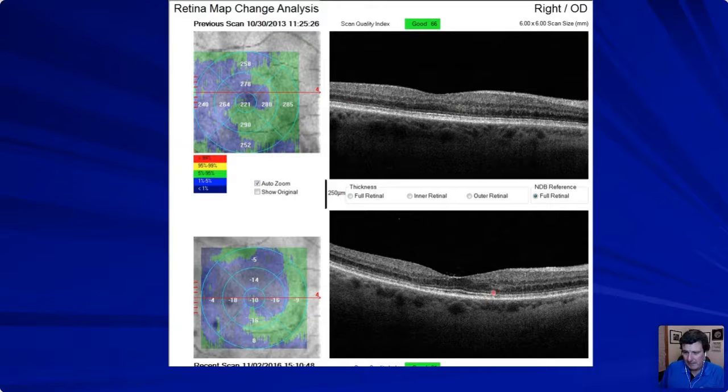But look what happened in 2016. It's a little bit more obvious. There's two ways I'm going to tell you. You want to look in this area, but look at the contour. I'm trying to work with the designers of these OCTs for Plaquenil toxicity. You see, you got this kind of, I'm going to over-exaggerate, it's high, and it's low, and it comes back up. If this is crashing down, can we just take the retinal contour?